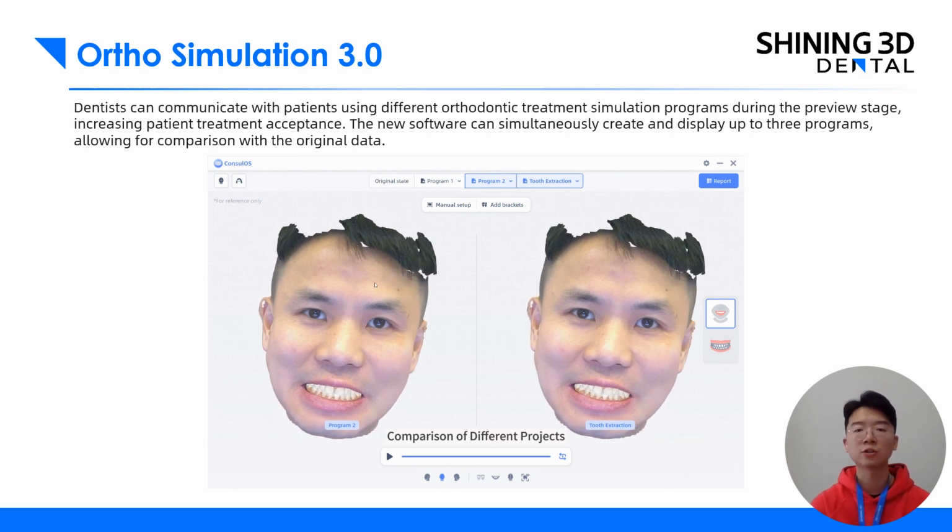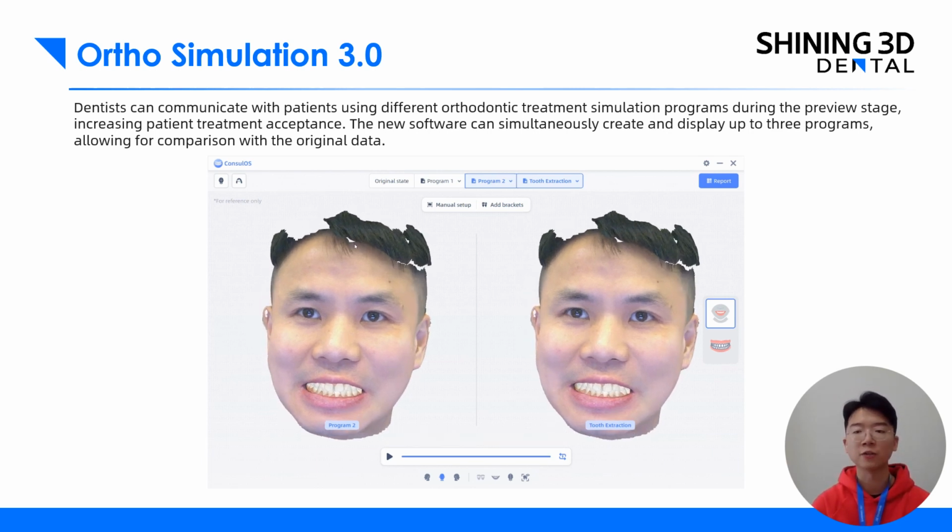So it can increase the efficiency of application, and the doctor can jump between different projects as well, and they can hide the facial data, only see the orthodontic data for the intraoral scan data, and they can add the data to the intraoral scan data as well.